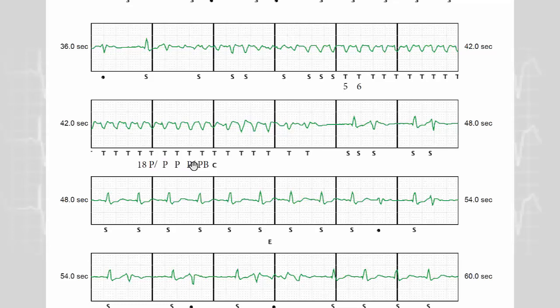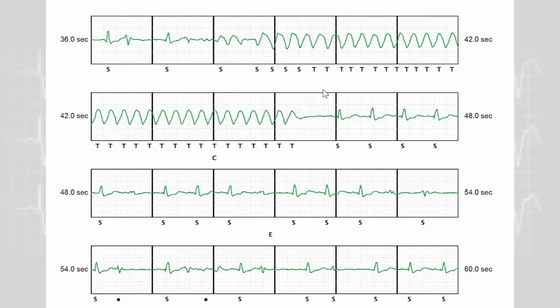Since in this patient there has been an episode of non-sustained arrhythmia with a charge of the capacitor, at the end of the counter 18 up to 24 there is one cycle of persistence, but now the device will require 3 additional beats of persistence, which is the case here, and then the processing beat, and then the charge of the capacitor. So this is another episode for the same patient.